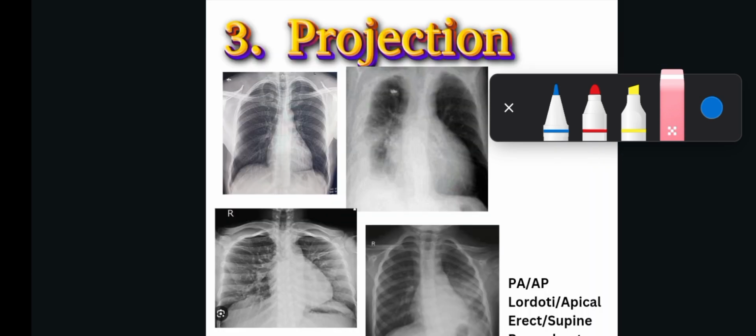Now, X-ray is normally obtained in a PA view or projection. Every other view we obtain, if we're using digital imaging, it is good to label those views so that the person using the image will be guided properly. Because in most cases, the structures we rely on to identify which view was used do not, in some cases, appear helpful to give us a clear distinction from the other views.